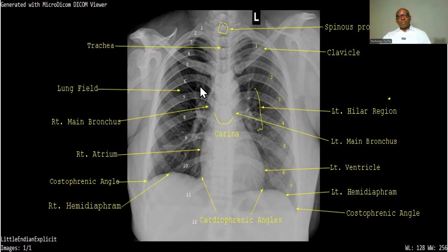This simply shows that the lungs contain air, while these other structures absorb radiation at different levels. But there's a free transmission of radiation in the lungs because they contain air. Nothing is stopping the radiation.